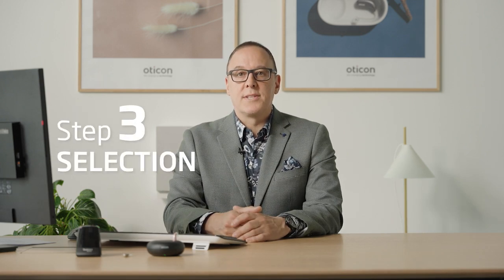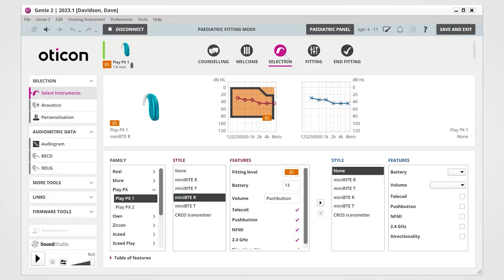That brings us to Step 3. The selection process. On the screen, we see a number of different options for us to draw our attention to. First is the center of the screen. We have this orange graph, and this orange graph is representing the fitting range of that particular hearing aid. So we see the Play PX1 and the audiogram that we've entered is well within that orange graph, indicating that it is a good fit for this particular child.